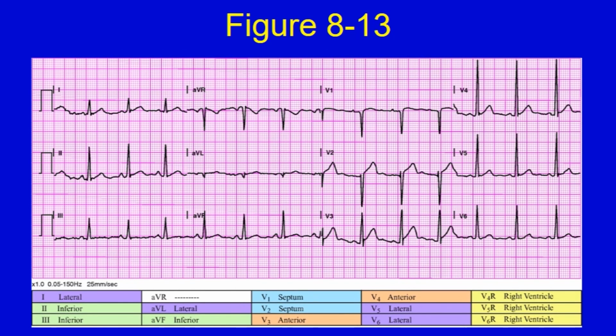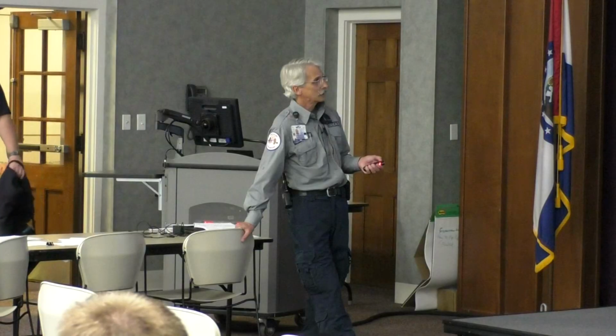Any elevations? V1 has, if it's got a square, it's pushing it. V2 and V3, though, I think have the elevation in them. I doubt that V4 does. But we'll agree on these two right here, okay?